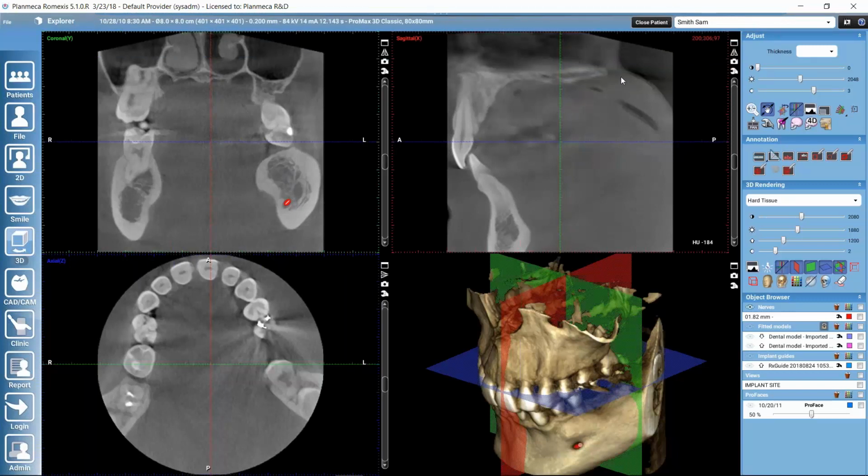And if we would like to view only the raw data and we would like to get rid of these overlays that we have here to help us with the data, we can hide the overlay by using this annotation overlay button. So now we got rid of all the overlays. And if we wouldn't like to get rid of all of them simultaneously, but we would like to determine which of them would be disappearing, we can open this default settings.